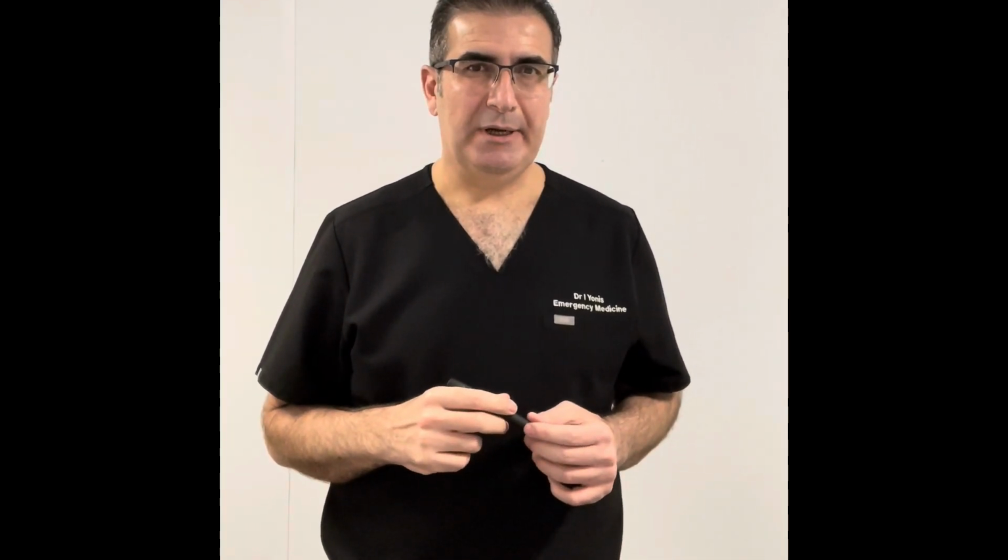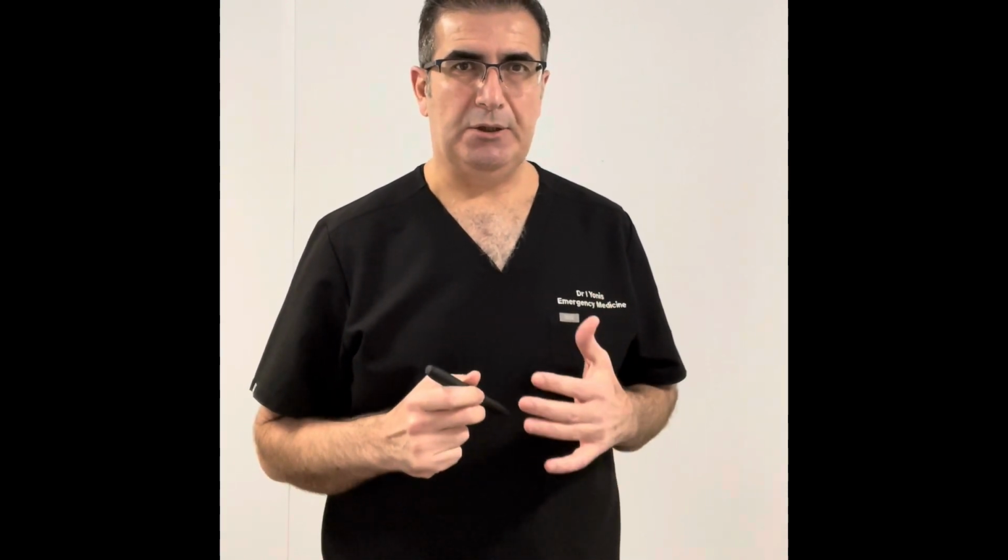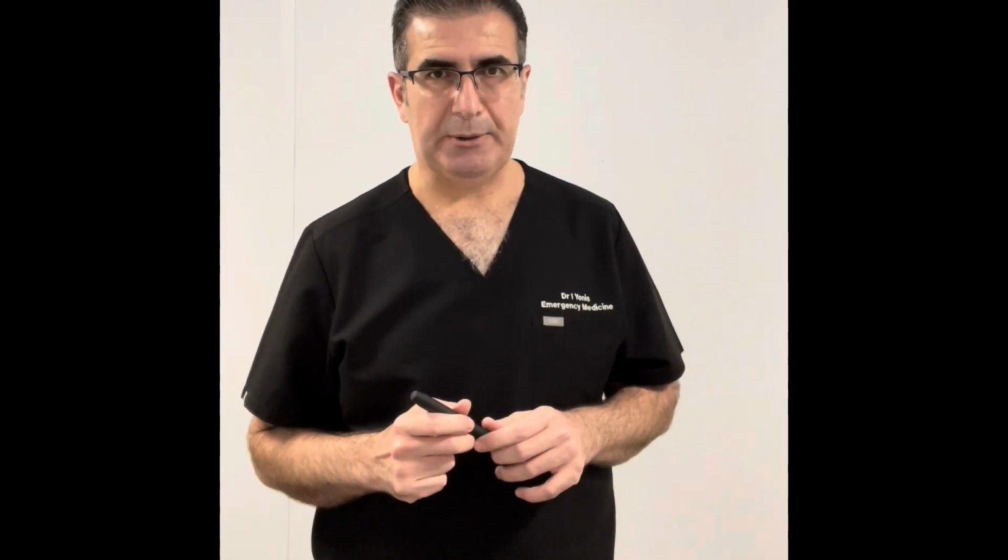So these are the two main protocols that we normally use to evaluate patients who present to the emergency department with non-traumatic shock. By understanding the physics and the procedure, how to perform the ultrasound, you will be able to find out the reason for that shock, and you will be able to manage those patients properly. I hope I covered those protocols in a nice, smooth, simple way.